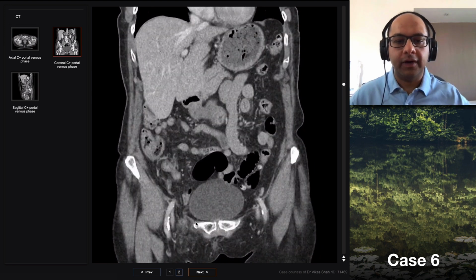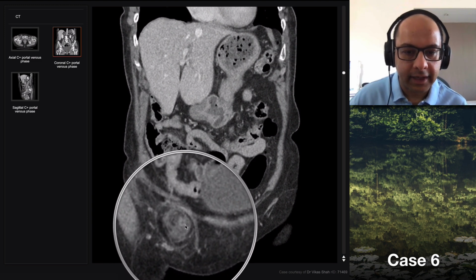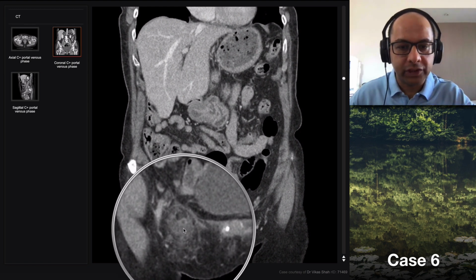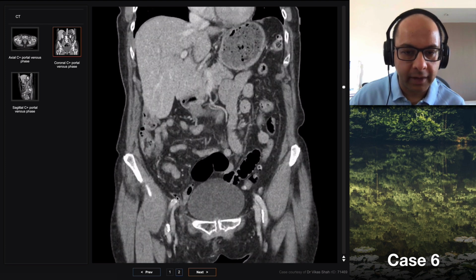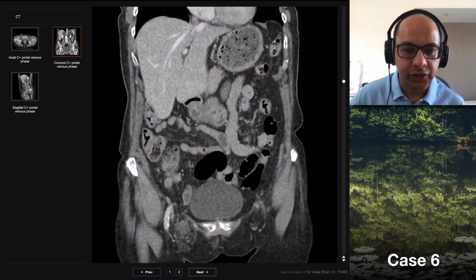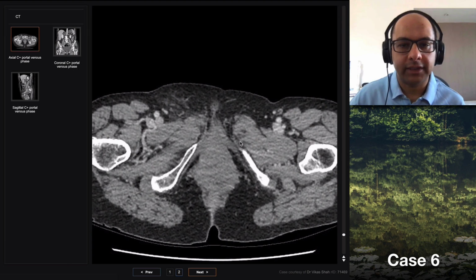Okay, let's just deal with that bit first. I agree with you that down here, within this bulbous bit of tissue, there is centrally something which looks like a tubular structure. If we follow that back up, I think it joins up with this here, which is the appendix. I can't think of what other tubular structure this would be, and it does join up, so I think that's the appendix. So the next question is, what kind of hernia is this?